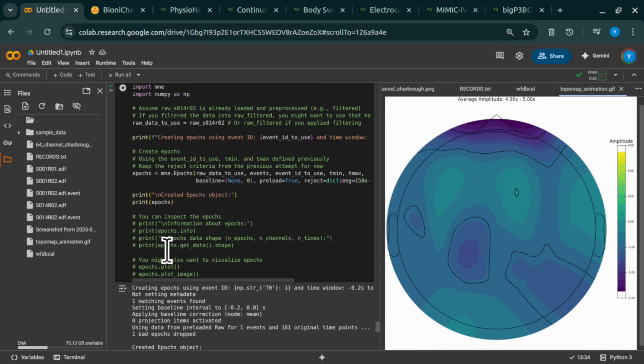Another real-world data thing. Standards are great, but datasets don't always follow them perfectly. You have to double-check. Always keeping you on your toes. Yeah. Okay, channel mapping sorted, then the big visualization, the aha moment. You mentioned topomap. Topomaps, yes, they are fantastic.